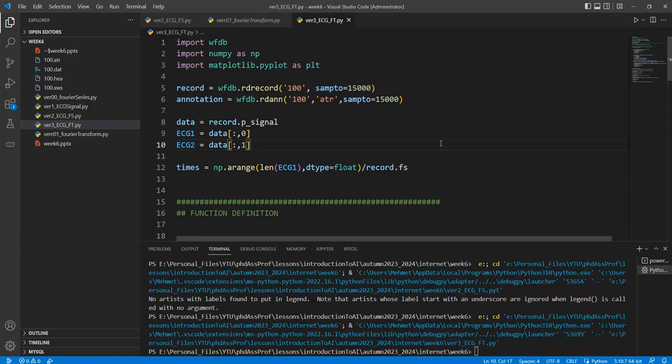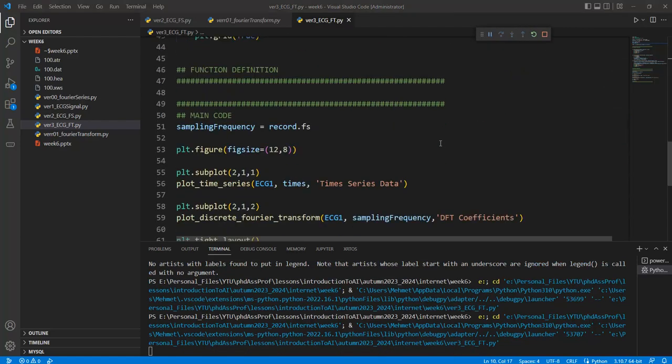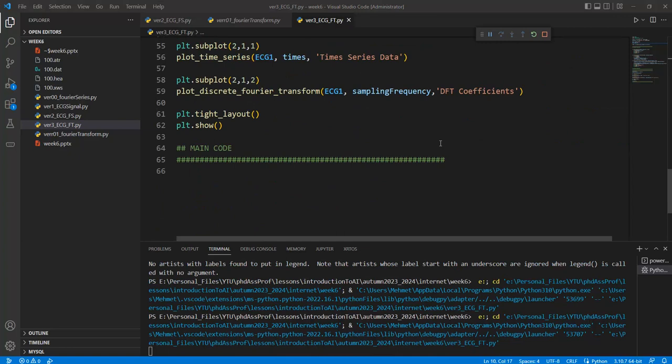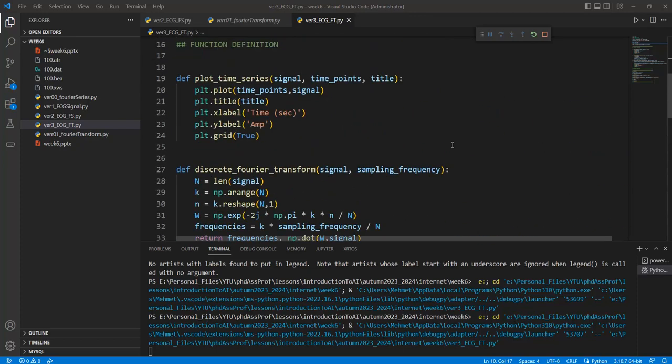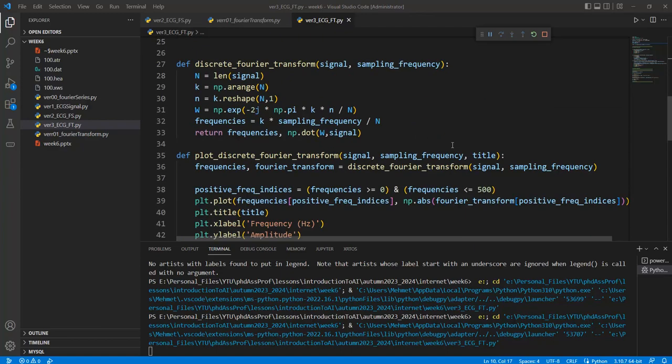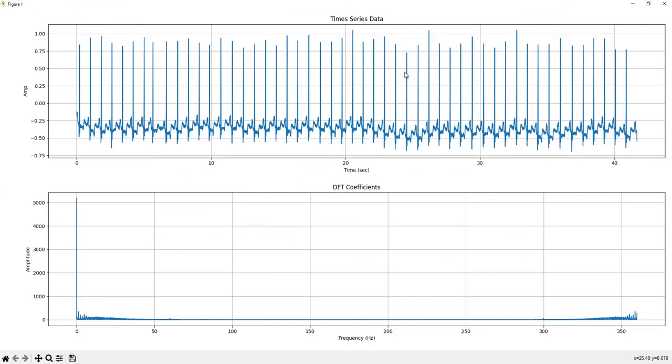I can do that, because if we have used more data in here, with 15 times, we may have more information from this time, because in each beat the data is compressed into the frequency characteristic, and so this is a more accurate representation of our signals. Yes.